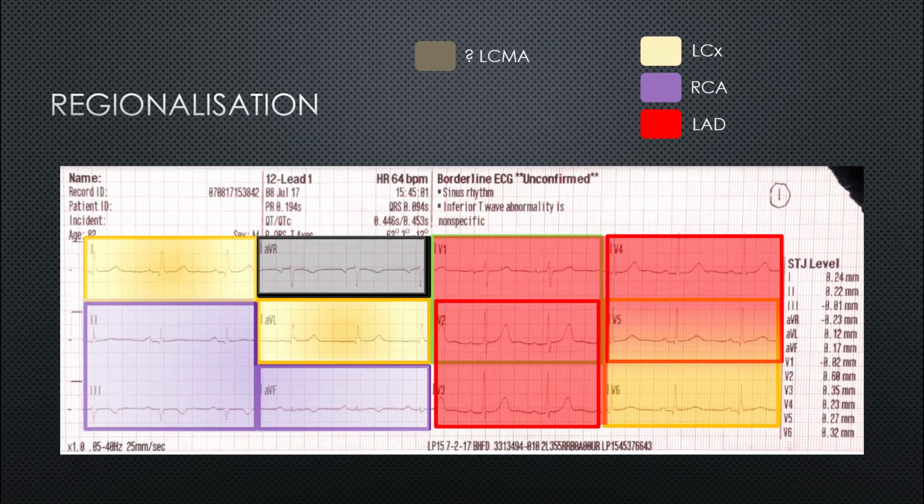From a diagnostic perspective, the significance of ST segment elevation in lead AVR has become more prevalent. Once this was considered to be the other lead and was the orphan on the printout. However, its association with the occlusion of the left main coronary artery and/or multi-vessel disease has come to the fore with recent research.